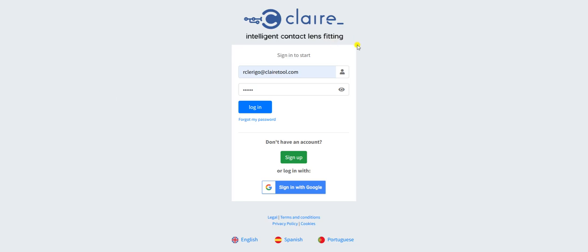Hi everyone, and welcome to this video tutorial where we are going to perform a walkthrough over two applications or two calculators, or in better words, the two fit assistants we've developed under the clairetool.com umbrella.